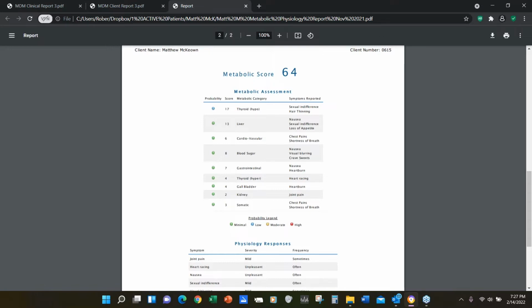We know what a lot of these things do to the brain map, and we want to know, is there stuff that's going to interfere that's physiological? This is a suggestion of what might be happening, and you might want to double check on this, because it could get in the way of what we're doing.